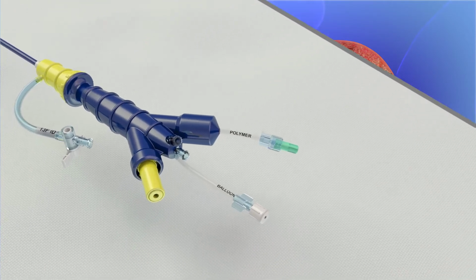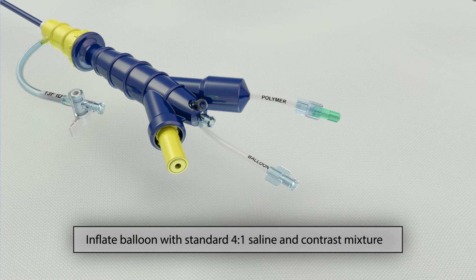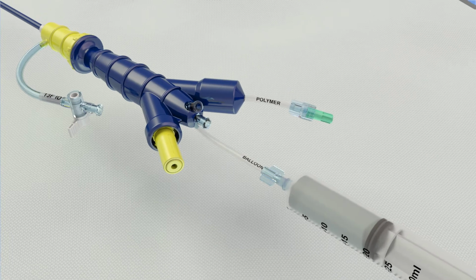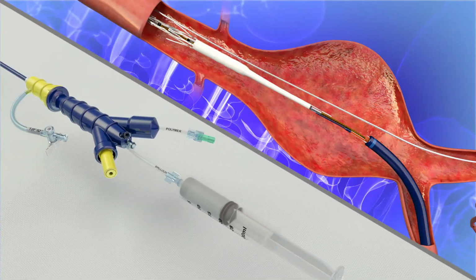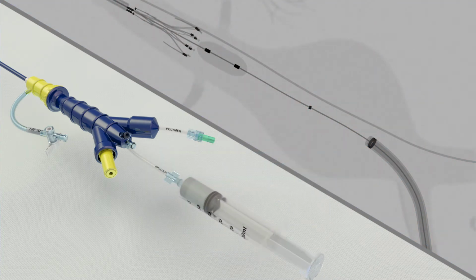To inflate the integral balloon, remove the white cap from the balloon injection port and connect a syringe filled with saline and contrast mixture to the balloon injection port. With the integral balloon already in position, inflate the balloon manually to open the graft radiopaque markers. Deflate the balloon by drawing back on the syringe.